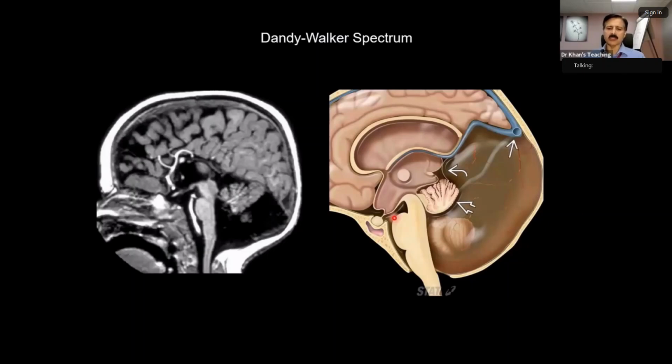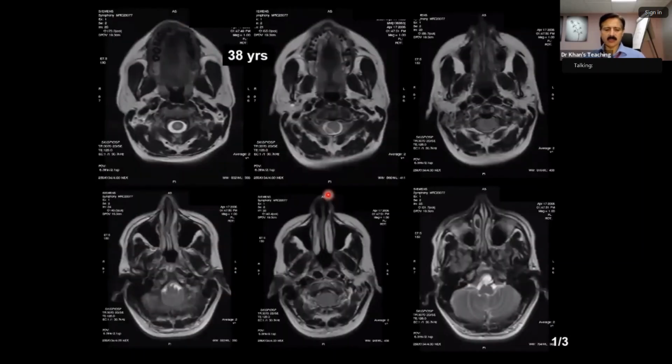It might be associated with hydrocephalus and corpus callosum abnormalities. In this case, there is hydrocephalus shown. But look at this complete agenesis or dysgenesis of the corpus callosum. The confluence of sinuses is moved. So I will skip it. It's too easy.